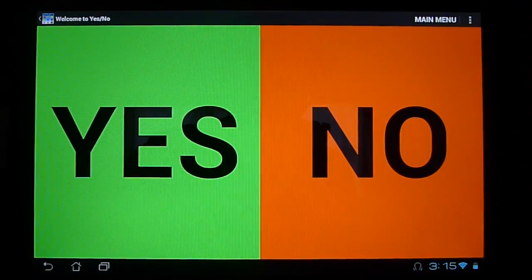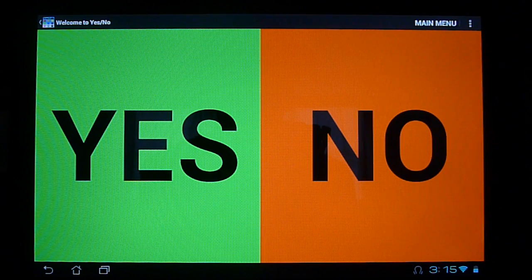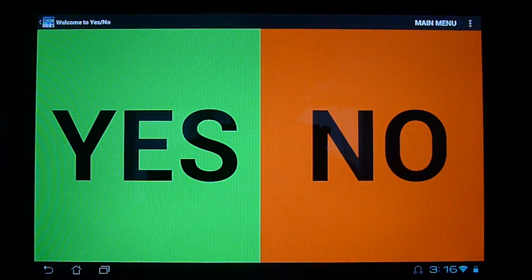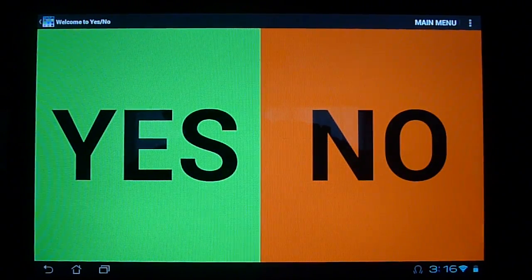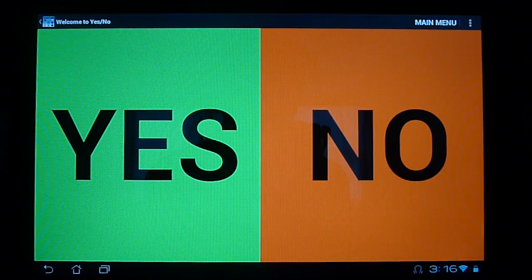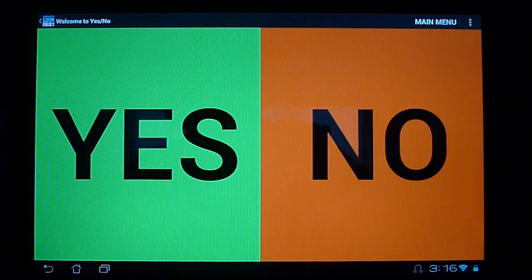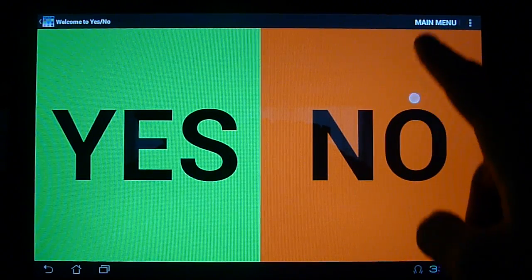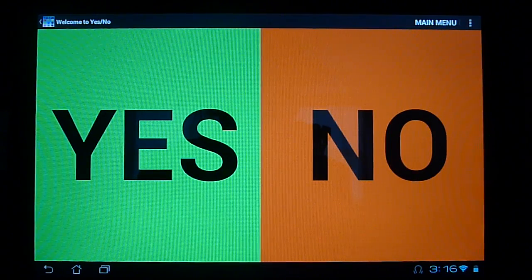The yes/no feature is meant to be a convenience feature just in case somebody has to answer a basic question that requires a yes/no answer. So if the question is asked, the individual can simply click yes or click here. No. And you notice how I clicked and released right away, just to make sure that clients of all abilities can use this application. We made sure that if the person just holds their finger for a couple seconds, yes, it'll automatically play. So no matter where you are, if you just slide through a little bit, it'll play. So that's meant to be a feature of convenience.